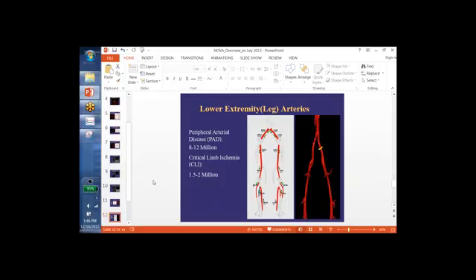This gives a range of the applications that are possible with NOVA using the same software and choosing the specific application of interest, but the basic technique and the operations and navigation of the software that the technologists will have learned will transfer over to any of these applications.